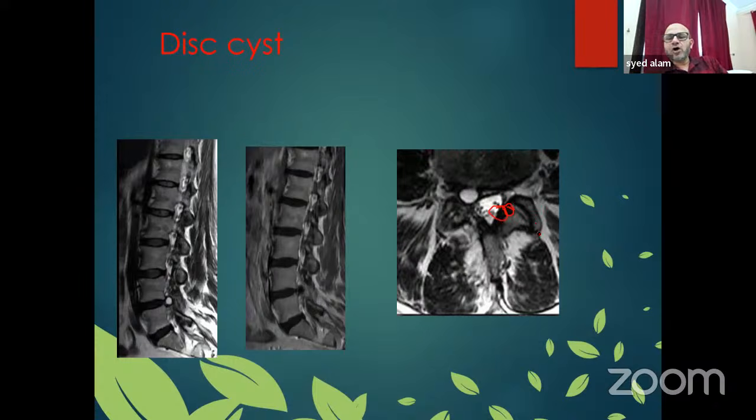So sometimes the orthopedic surgeon goes by here, by the facet joint, and pushes water and makes it burst. The patient improves. So this is for the synovial cyst. This cyst is a disc degenerative cyst. So these facet cysts are very common. Sometimes they are inside, sometimes they are outside. Quite common, very common.